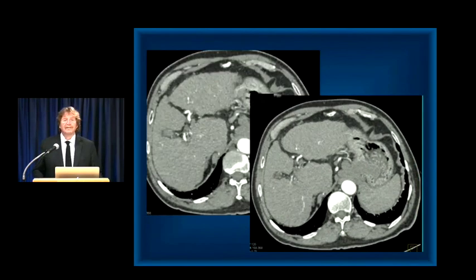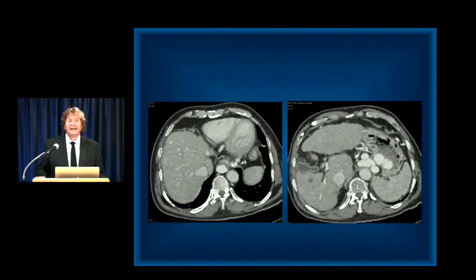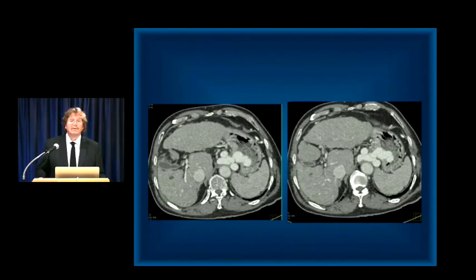Just a couple more images. You can see the textural, this sort of grainy appearance to the liver. You don't see any focal lesions. You don't see any AV shunting, but you might. And you can see in that case, as you go to later phase imaging, when you go to venous phase, you see the large varices in the esophagus and gastric fundus. You see the nodularity to the liver, and you see a slightly mottled enhancement pattern, which is again shown here as well.